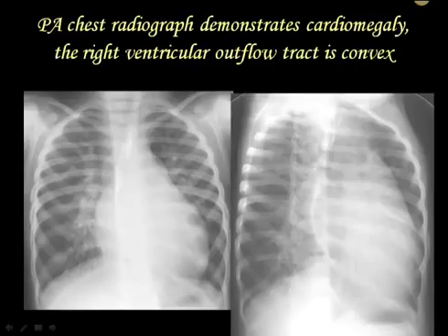Okay, cardiomegaly, or an enlarged heart, as we've talked about, can be caused by a number of different things. It can be caused by enlarged muscle. It can be caused by a pericardial effusion. It can be caused by big dilated chambers inside the heart. We can't tell these things on a plain chest x-ray because there is no difference between myocardium versus fluid versus blood. We don't see any of that. To see anything requires that you put something different in, and that's exactly what they've done here.